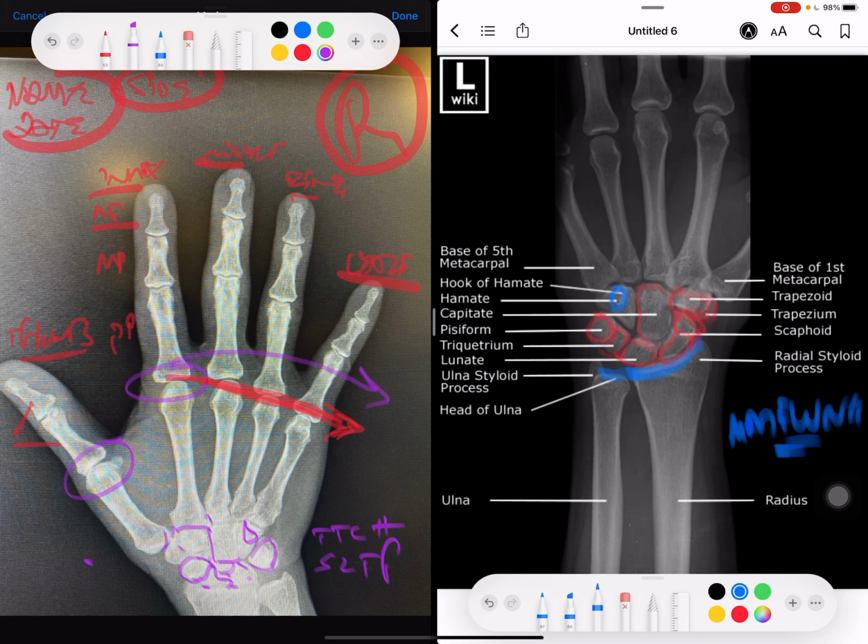There'll be bone cysts, but there won't be spurs, because the cysts are actually made of acid, usually like hyaluronic acid and stuff. They're filled with that from the joint, so it eats up some of the bone too. So rheumatoid arthritis, first of all, will have cysts, but won't have spurs. You'll also see ligament injury, so the whole bones will be slid over, and then they shake hands. Their hands are like that, skewed. It's all skewed out to one side because all the ligaments are weak and torn.